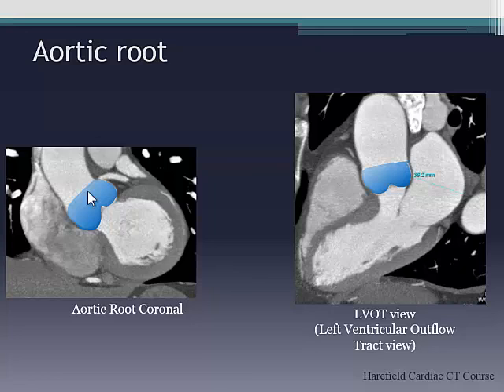The important thing to remember is if you look at the aortic annulus, and you'll see throughout the duration of the course, that the annulus is not round, okay, it's an ellipse. So traditionally, when you measure on echo, you're measuring the sagittal view, but you'll actually see that the coronal view tends to give you a bigger dimension. So, for example, when we report on MRI or when we report on CT, you often report the bigger dimension. So you can have a big discrepancy between the echo measurement of the root and the CT or MR measurement, and the reason for that is because it's an ellipse.